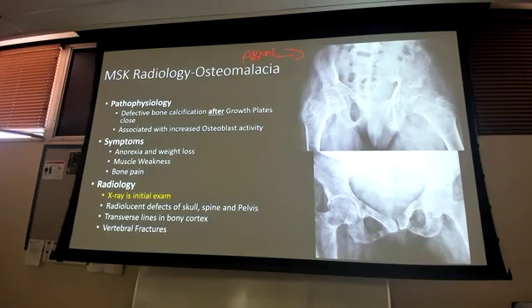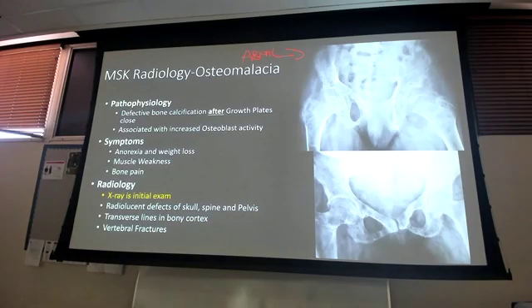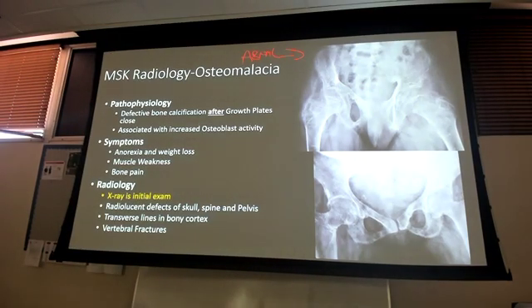So where are the radiolucent defects in this bone? The radiolucent defects are in the medullary bone area, similar to the osteoporosis. Look how dark this is. We'll use the knee, it's okay, it's very similar, right? I want you to focus on what that medullary area looks like and the color of that in the tibia and the femur. Now look at how much darker it is in this area here. That's where you're getting that radiolucency, and you get it up here in the wing of the pelvis as well.